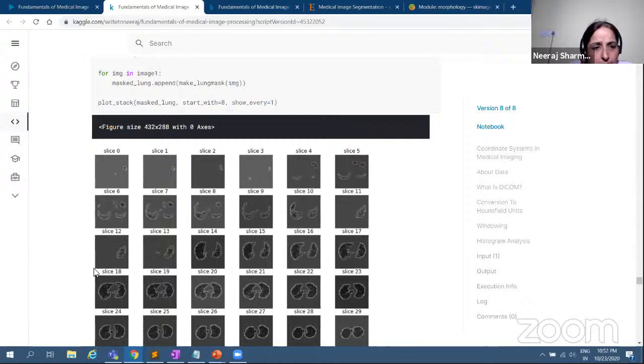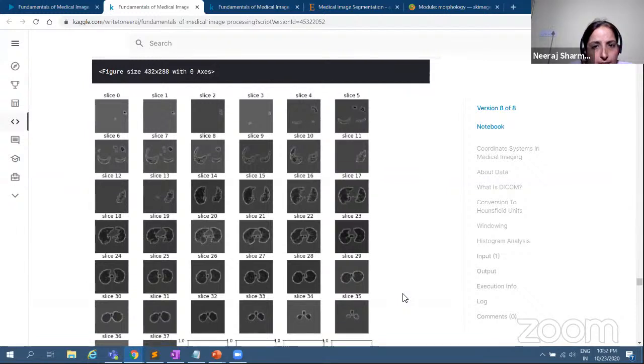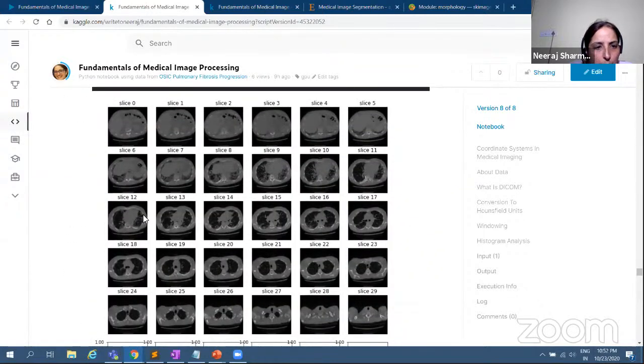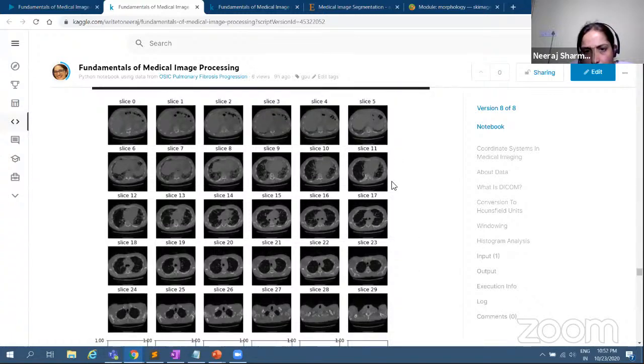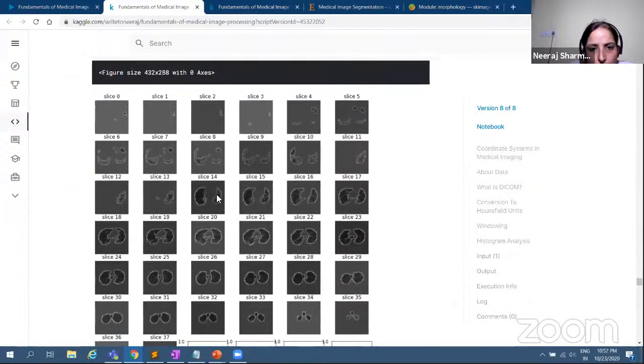And then we see a few more slices got introduced after resampling, and I am just assuming that slices 11, 12, and 13 are like that, because here 11, 12, and 13 are totally different. And slice 11 looks more similar to slice 14, and then it continues.